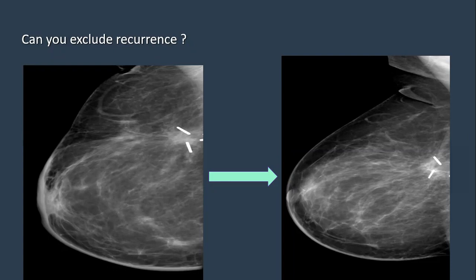It will be the same. There is something pushing that calcification, or it's getting fragmented. So there is something eating, infiltrating. You see? If the calcification is a coarse, large dystrophic type and getting fragmented, that means there are underlying lesions resulting in fragmentation, and this is an indirect sign for recurrence. You got the point now, okay?